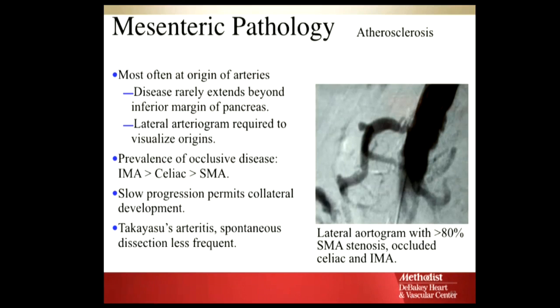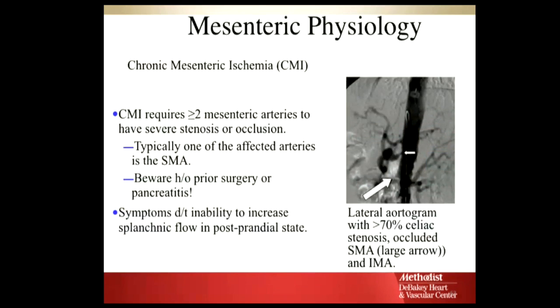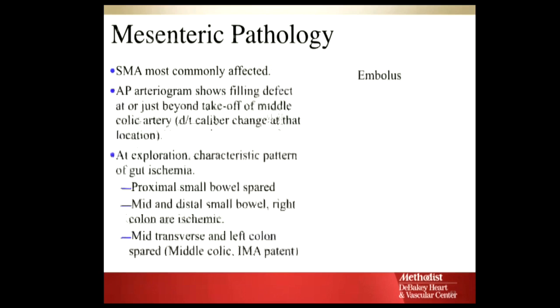And again, it's why it can be very confusing by just presenting you the same data in a different direction. You're looking cross-table lateral, and you've got these renal arteries, which you're used to seeing coming straight out the side of the aorta, coming straight at you, or running away from you. What does it say it was? Not normal. Okay, we'll move on from that.